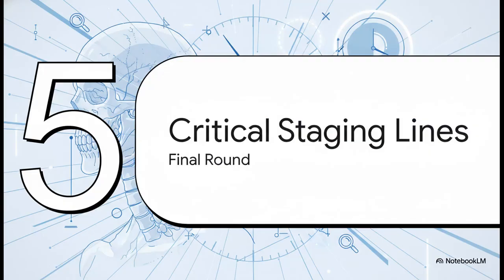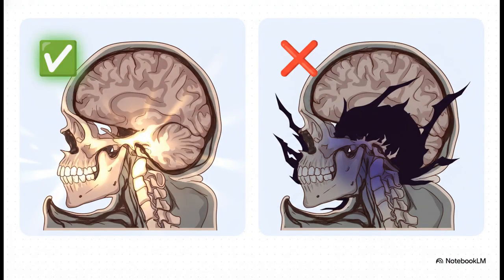All right, we're in the final round now. These are the absolute make-or-break radiological findings, the ones that have huge implications for staging and for surgery. Pay close attention here. So for tumors like nasopharyngeal carcinoma, you have to check the skull base.